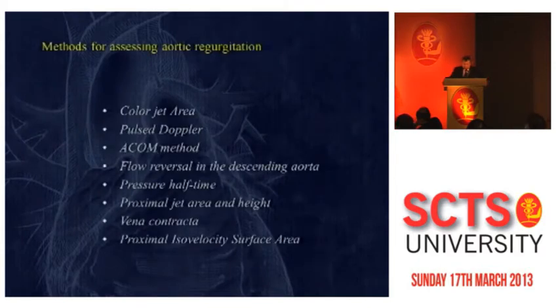So let's start with echocardiography. As you can see here, there are quite a few methods to assess the severity of aortic regurgitation. This means that none of them is perfect, and they should be used in combination to come up with the right diagnosis. And I will go across most of them very briefly to show you how we do that.